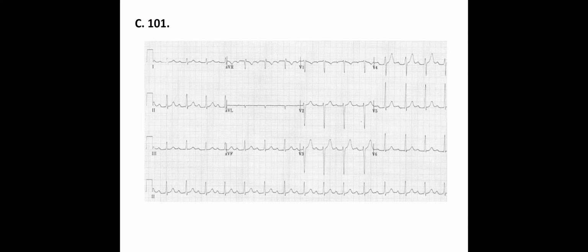So in this one, I counted the BPM. It was approximately 90. It appears to be rhythmic. The P wave is present and appears uniform as well.